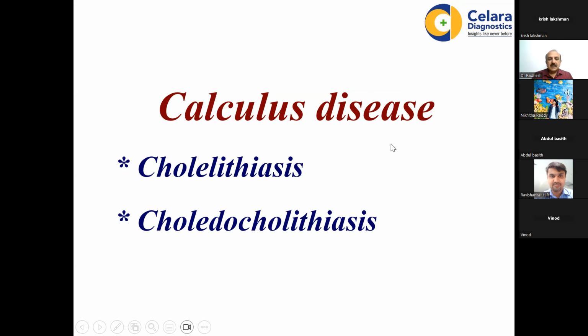Now let's look at, Rajesh, just a clarification. One of the things that they usually attribute to the choledochal cyst is a long common channel, is that not a common feature in every case? No, I think it's only around 15 to 20% of the cases where we see this. But if we see a choledochal cyst, we have to look at the length of the common channel, if it is there.